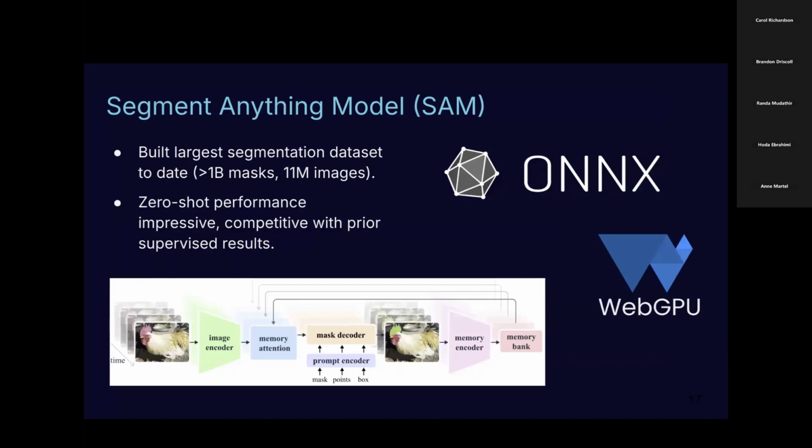So MONAI solution, as I said, is great, but it requires maintaining a server, meaning that you have to deploy it somewhere. That server has to have access to one of the NVIDIA GPUs, most probably. You need to set up an infrastructure and handle authentication between server and front end. It is sometimes painful, but sometimes it's required. The model is huge enough that you can't avoid that. For complex scenarios, you can't avoid that.